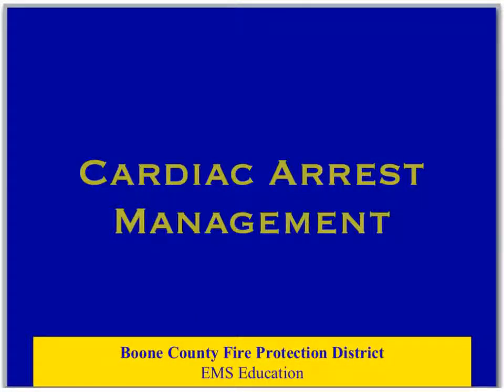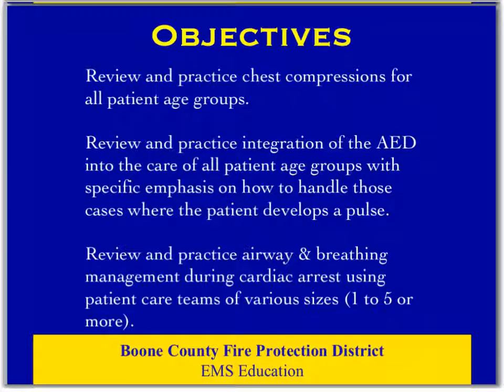This is the Cardiac Arrest Management Review and Practice lesson. We'll review and practice proper chest compressions for all patient age groups. We'll review and practice how to integrate the AED into the care of all age groups of patients, and we'll particularly talk about how to handle those cases where the patient does develop a pulse after some of our treatment and how we manage the AED from there.